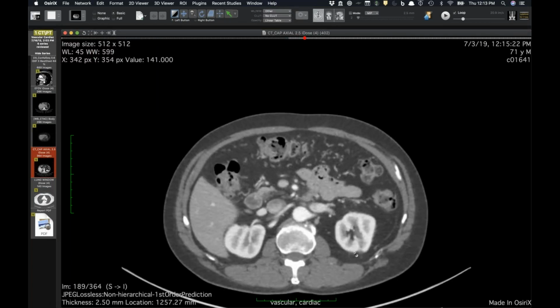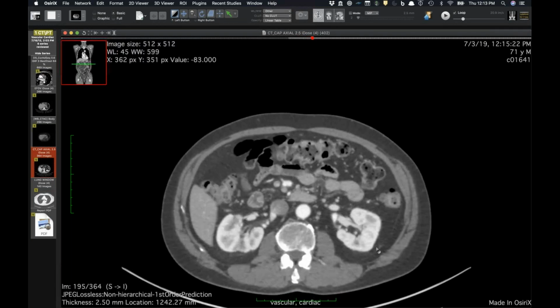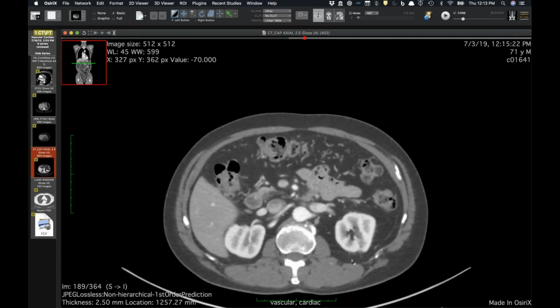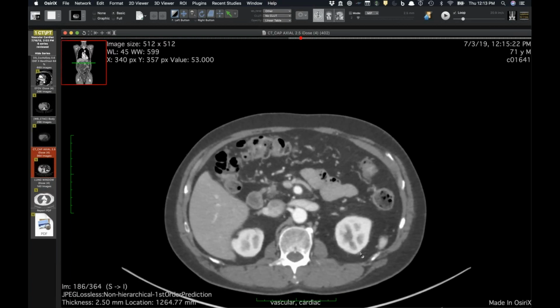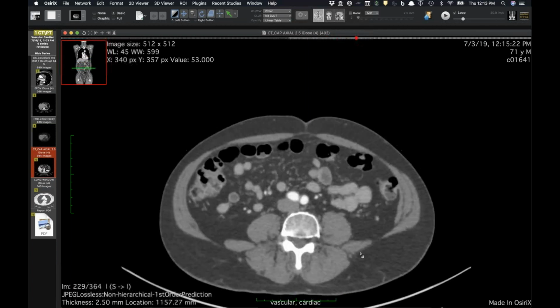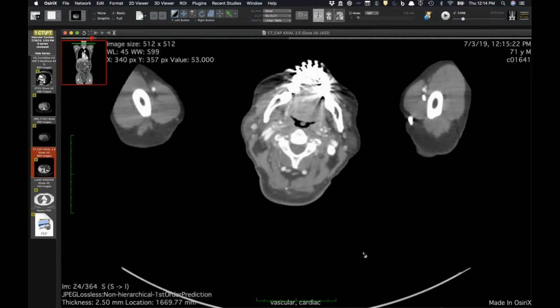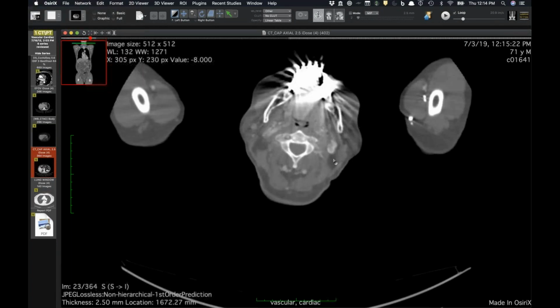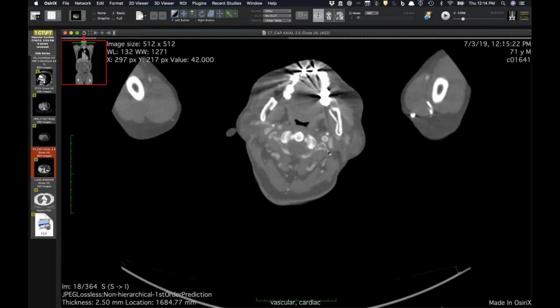You can see at this point, he has some scar around his kidneys, and unfortunately, I don't have any of this imaging, but he had bilateral renal masses that were biopsied at around the same time, and it was all eventually determined to be IgG4 lymphoplasmacytic infiltrate. So he was diagnosed with IgG4 related systemic disease. Also around that time, he had a stroke and was found to have a left carotid artery aneurysm and dissection, for which he received a stent, as you see here.